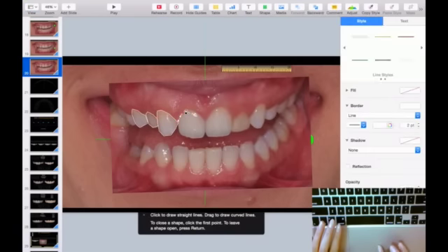So here you can take longer time or shorter time depending on how precise you want to do this.